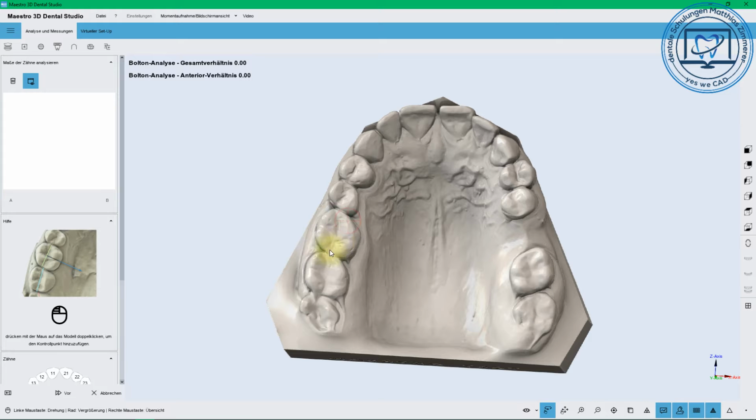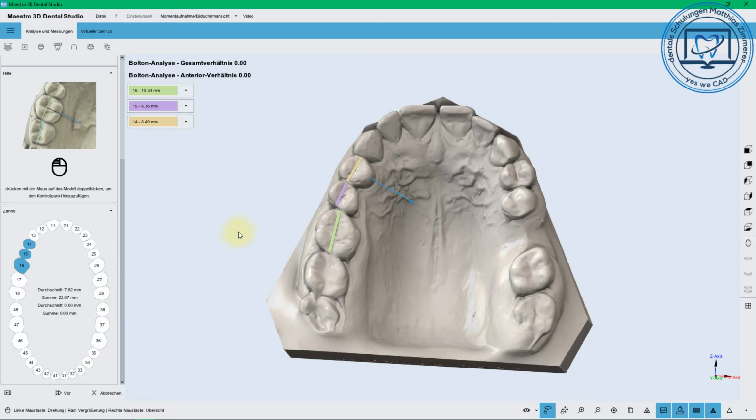And then we are going to the tooth segmentation, and first we have to set up the width of the teeth. You have a fine adjustment possibility, and always keep in mind, if you make the first 2 points, set up the numbers. If you start from the first, in this case the 1/6, you just have to put in the number of the tooth the first time, and if you go ahead, the next numbers are already the right ones. You have it here in the schema also.